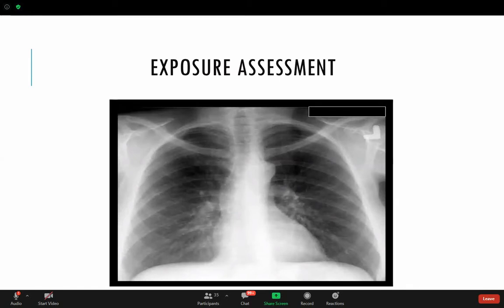Body position might be important for the chest X-ray being central, but it doesn't determine the exposure. Good inspiration, contrast, clavicle. Penetration, how can we determine the penetration? Contrast, those are a good try, but not really.